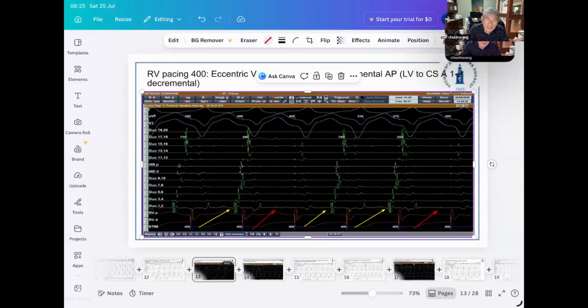And as you know, PJRT tachycardia can be slow like this. This is not unusual. It's a very unusually slow tachycardia, even for a left-side pathway. Second is that it's decremental. Now, do we have any concrete evidence that this is a PJRT type of tachycardia? We don't. PJRT tachycardia is decremental because it involves some degree of slow pathway. In this patient, post-ablation, there was no jump and no slow pathway conduction. So I don't know whether that would be the right answer, but I certainly cannot tell you 100%.